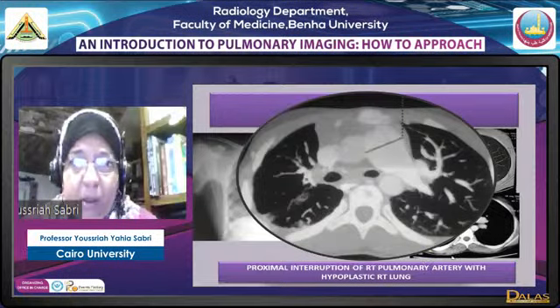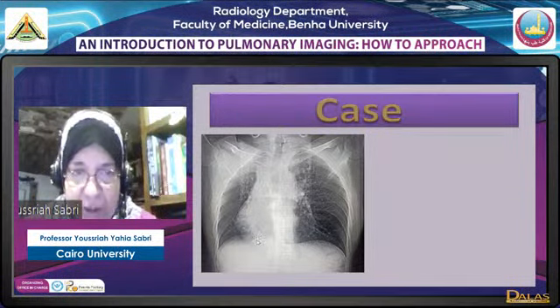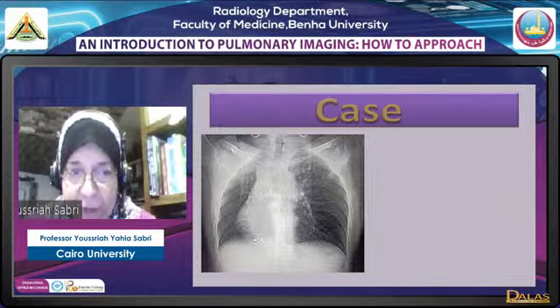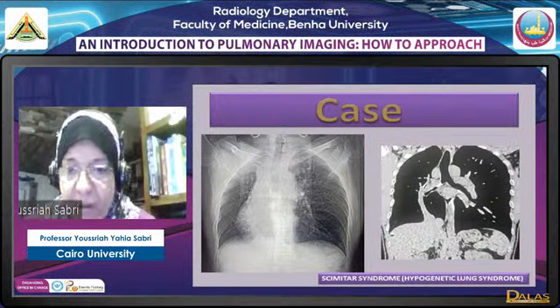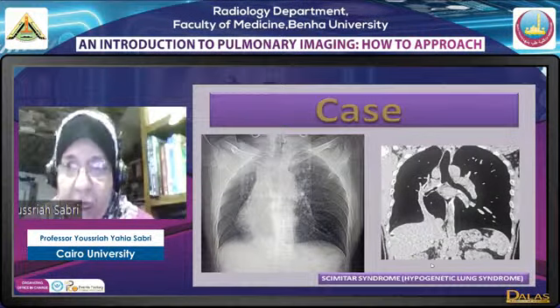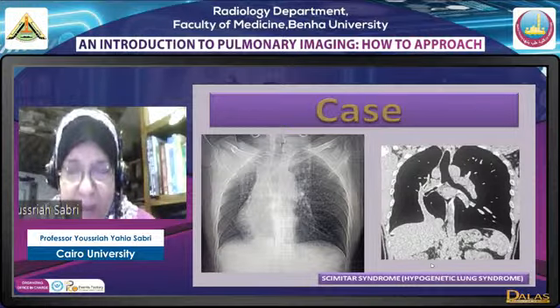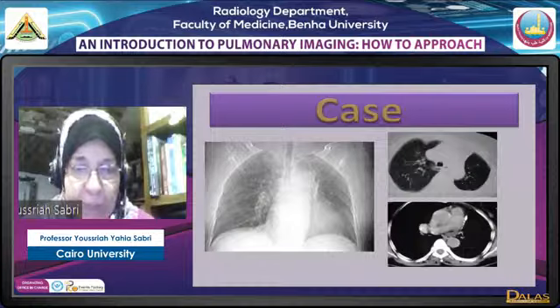Okay. Another case here: again we have a small lung, shift of the mediastinum and heart, abnormal configuration, and as you can see here, there is a suspicious vascular structure behind the heart. Okay, scimitar looking actually, and this is a coronal image. This is scimitar syndrome, which is what we call a hypogenetic lung syndrome, considered a partial anomalous pulmonary venous drainage. Again, a small, hypoplastic lung.